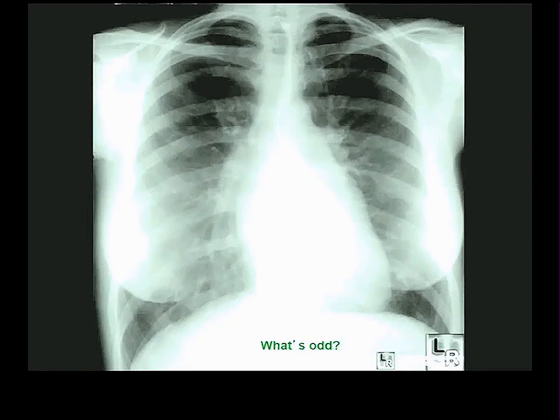So what is the 3rd bulge in your opinion? Is it a blockage in the valve? Well, you're dead on going to be correct. He says a blockage in the valve. What you're seeing here, this bulge, which should not be here, because here's aorta, right there. Here's pulmonary trunk, right there. That bulge should be a concavity. This is called left atrial hypertrophy, enlargement of the left atrium.